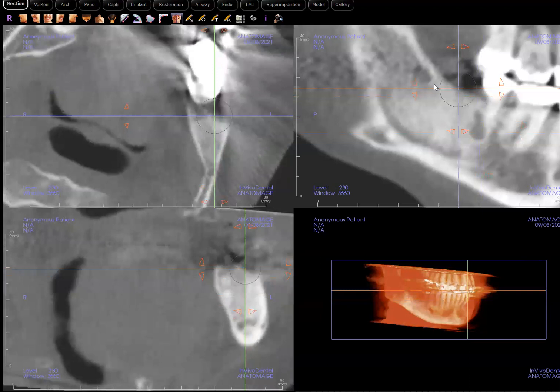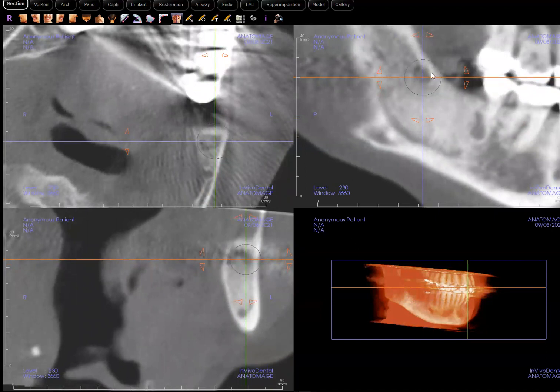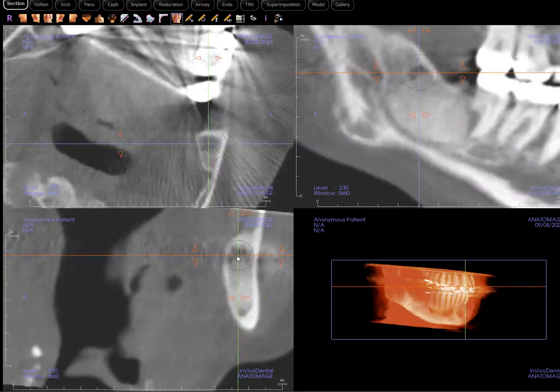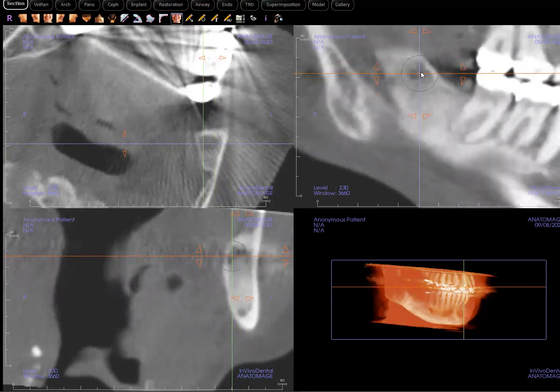Now, the other radiolucency that we saw at the superior aspect, even though it looked more prominent and better visualized on panoramic image compared to this one, where we really couldn't discern the presence of radiolucency, right? You probably didn't know it until I mentioned it on panel, but this lesion, or I shouldn't say lesion yet, this area, even though its bone density is low, I'm not entirely sure as of yet whether this is a recurrent lesion or not. It may just be that the graft material did not fill this defect entirely.